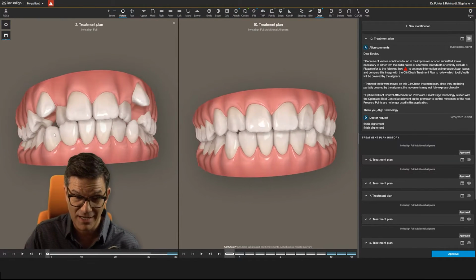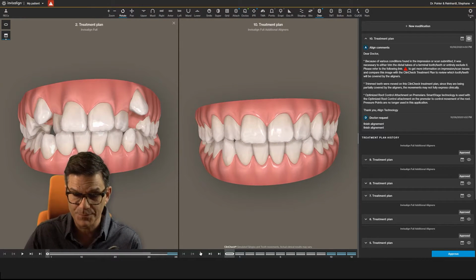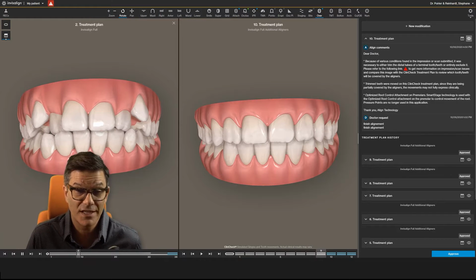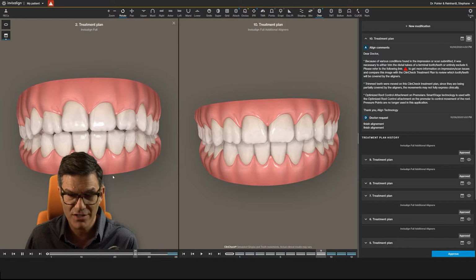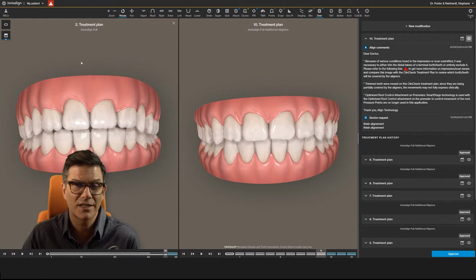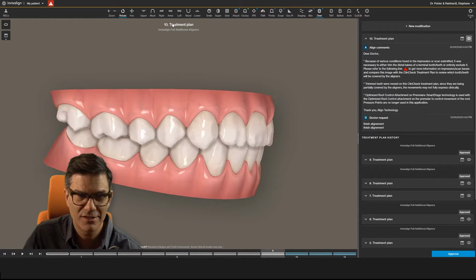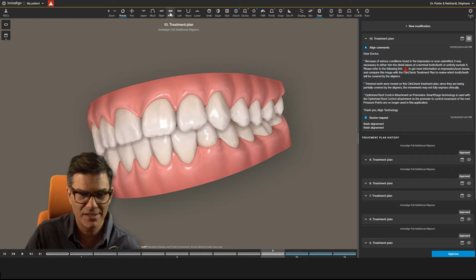The other thing is that I can do the movement of every stage on one side. It doesn't do it on the other side. Why? Because there are not the same number of stages, but I can look at the movements. This is when you study your cases, your additional aligners that you're doing, and you're trying to look at what worked, what didn't work. Those are your homeworks. This is where you're supposed to work. If you do this well, then everything will be easier after that.